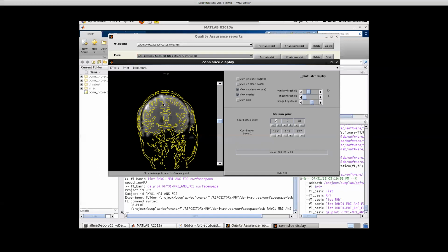Then looking at the actual surfaces in 3D for that individual subject might be nice as well. I don't know which type of cases. I imagine that sometimes FreeSurfer might produce weird looking surfaces, right? Like these holes or this kind of weird errors that might be simpler to catch if you actually look at the three-dimensional display of the surfaces for the individual subject. Or what cases are you thinking might be helped by having those type of displays?